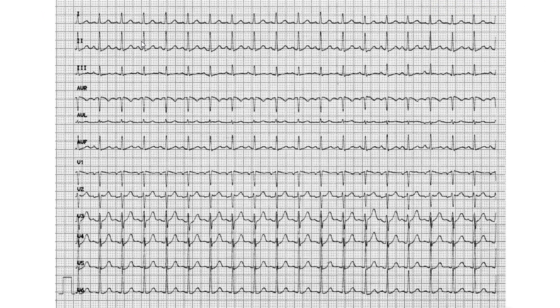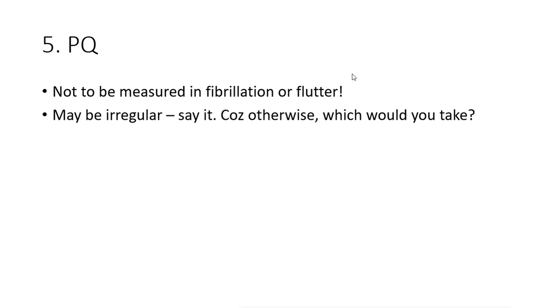And how about P waves? P waves are all right. So it's sinus rhythm. P waves are normal. Clearly, there's tachycardia. I'm not even going to calculate it. There's tachycardia, undoubted. Fourth point is you characterize the P wave. Then fifth point is you check the PQ. We're good. Okay. That's all for this question, and that is all for that part.